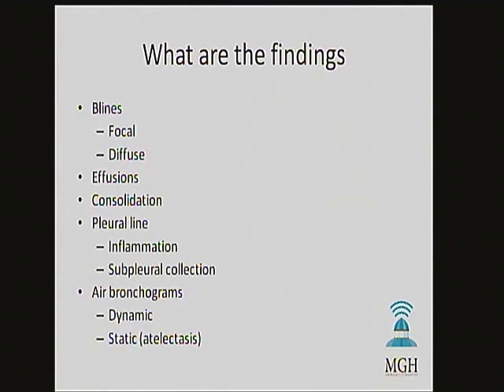All right, pneumonia. All the same findings are present when you have inflammation in adults or a pneumonia process, same thing as with bronchiolitis. And again, it's more of a spectrum. So you go from a few B lines to a lot of B lines to some pleural line abnormalities to some subpleural consolidations and then to that full consolidation with the air bronchograms that I showed you before.